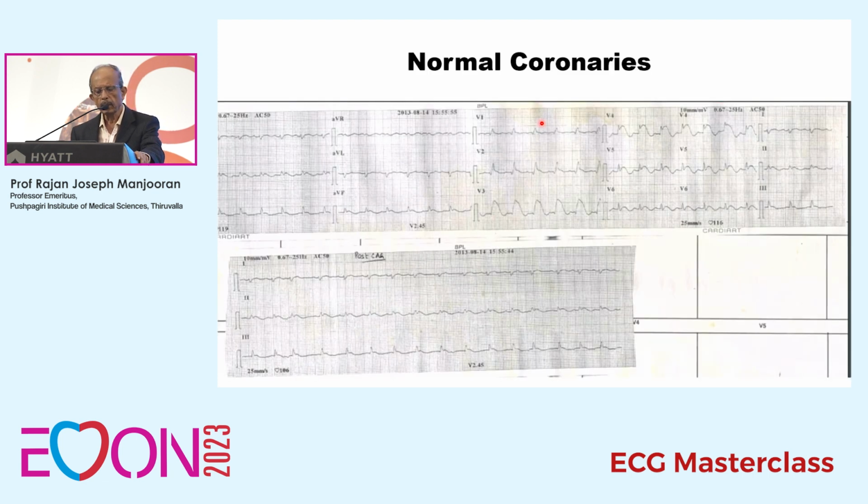This is very important. Pseudo-infarction patterns. There can be electrocardiographic abnormality which may indicate that the patient may be having an infarction, but actually it is a pseudo-infarction pattern. Here is a patient who has got ST elevation everywhere. I told you in my beginning lecture that when there is only ST elevation, you are right in making a diagnosis of acute myocardial infarction 55% of the time. You have to get reciprocal changes also. When you get reciprocal changes also, the correct diagnosis is almost 95%.